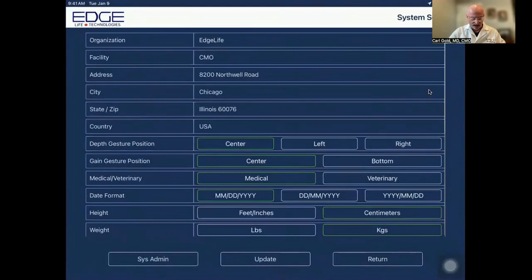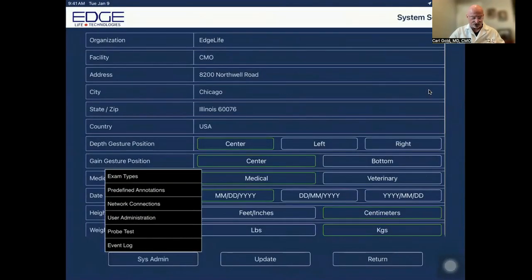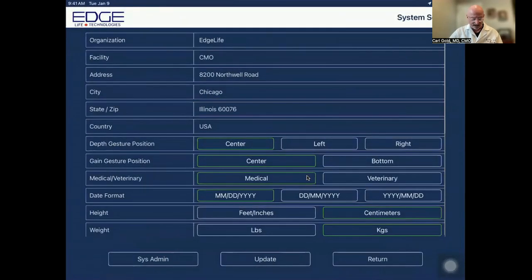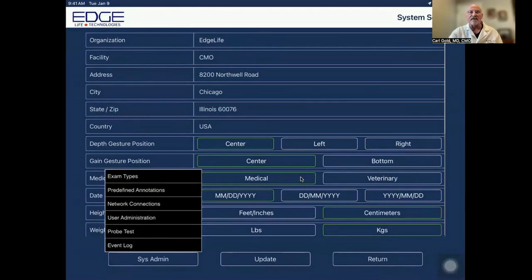Let me go quickly back, and under Sys Administrator, we did want to know how to set up the username and password. So under System Administrator, we're able to come to this screen and then start assigning usernames and passwords to create our list of authorized users. Provided that's not required, we won't come into that section of the screen. And we do have other features that we can control here under sysadmin, and I will come back to these later.